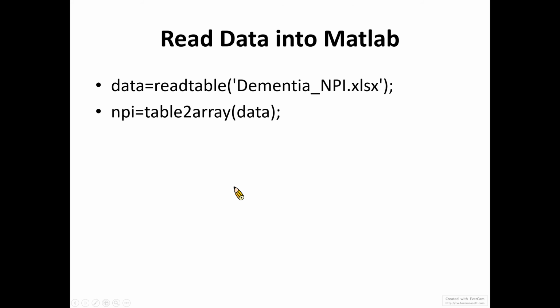And the first thing we will do is to read data into Matlab. So we can follow the command line shown in this slide to import the data I provide in the form of an Excel file into Matlab. In the first line of the code, we just use the readtable function, which I already used in the regression courses to show you how to read the Excel files into Matlab as a table data structure.